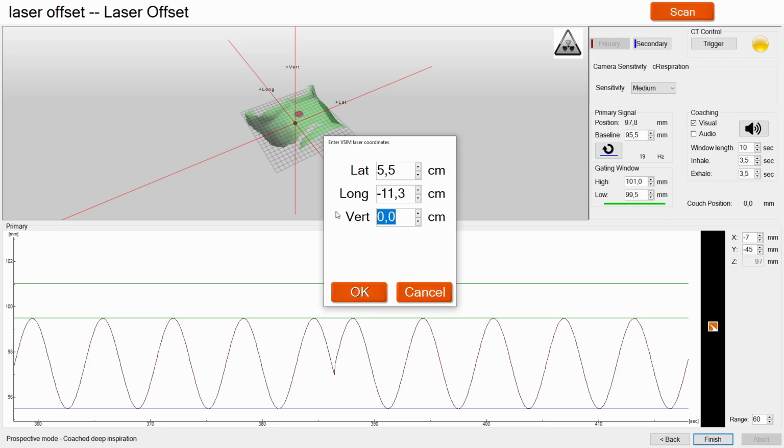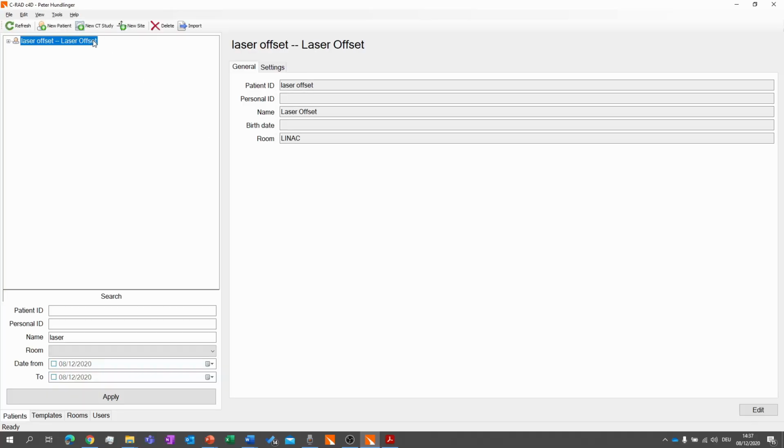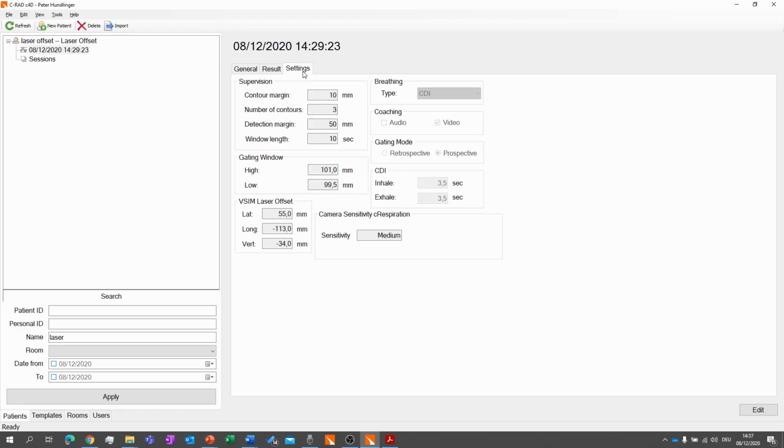Finally, also note for Siemens and Philips users. If you forgot to enter the vertical value and compensate after the Sentinel session, the couch height value will be stored in the CT data and can be usually retrieved from the image properties of the CT data.